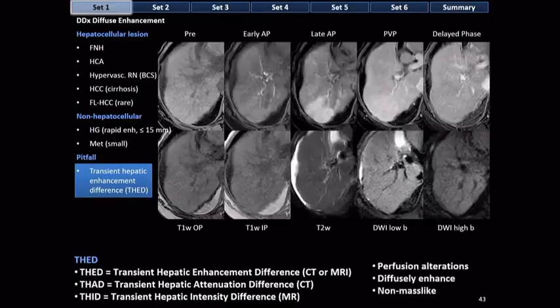So why is this important? This is important because sometimes radiologists get this stuff wrong. So here in the late arterial phase, top row, middle image, you will see a large observation hyperenhancing. And this was diagnosed by a radiologist as an HCC. This patient has cirrhosis, and this was embolized. The good news is that the embolization cured the patient of this abnormality, but what was this abnormality?